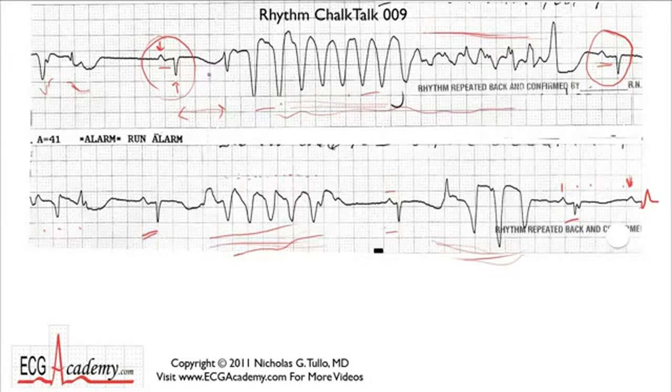So if we look at the T wave of this beat that precedes the tachycardia, I don't know about that.